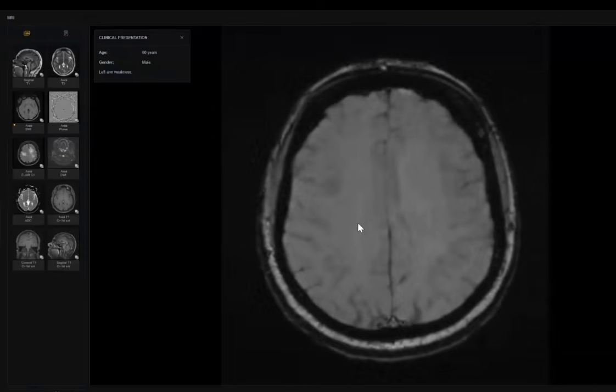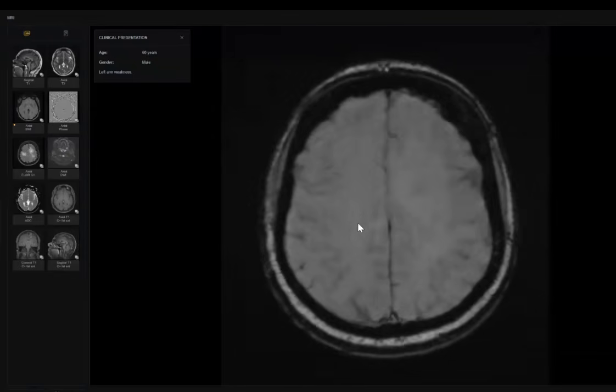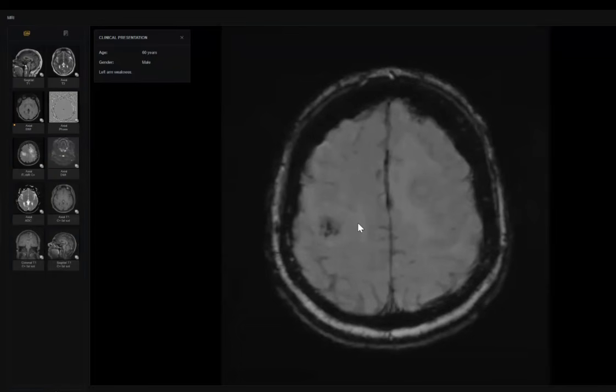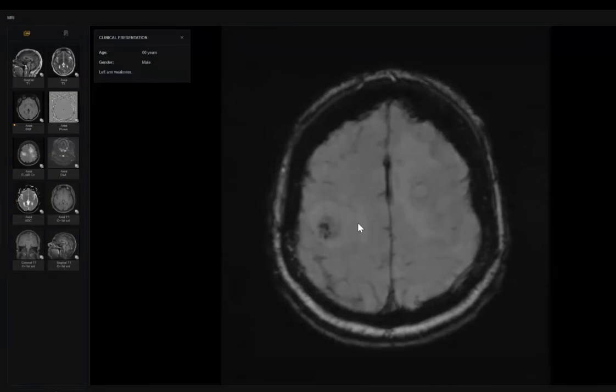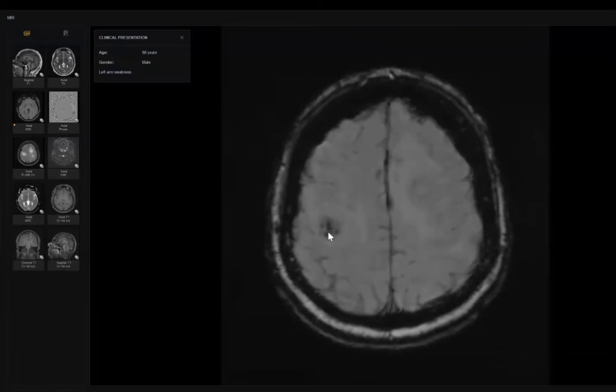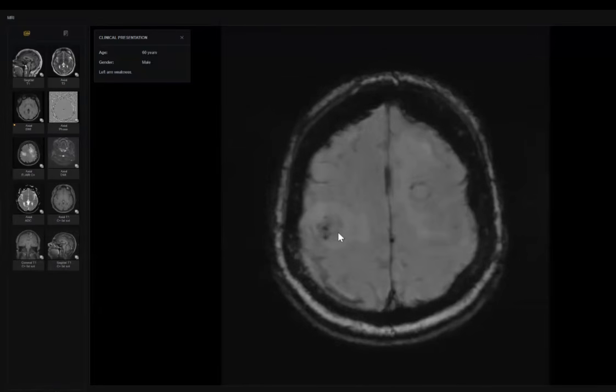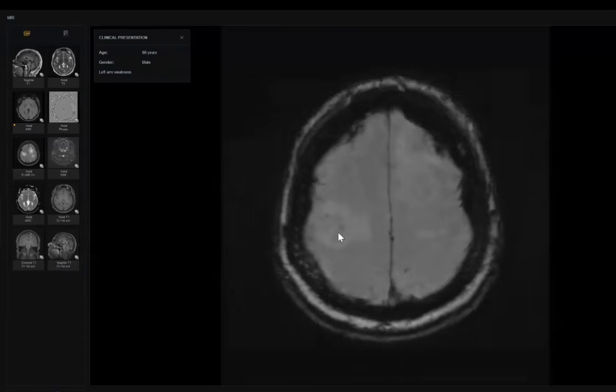Okay, what else? When the examiner is asking you what else, this means there is something in his mind you didn't reach. Calcifications. No, see, this is a calcified tumor containing SWI blooming artifact. You talk about hemorrhagic mets, and I didn't refuse. You talk about melanoma, I didn't refuse. What else?